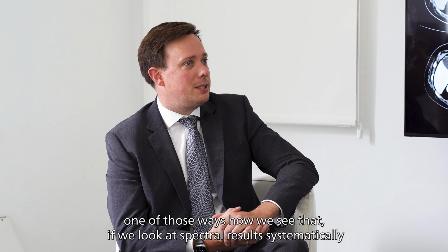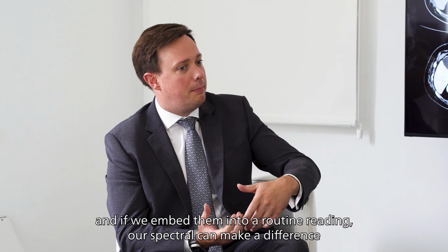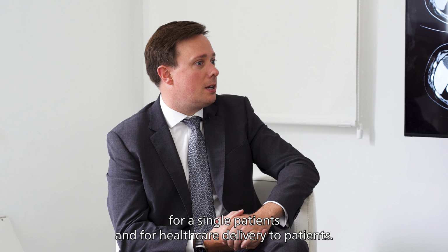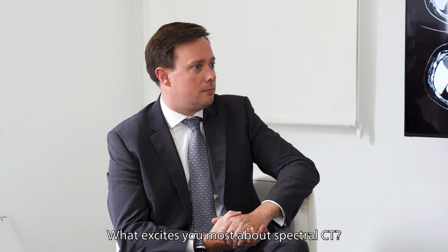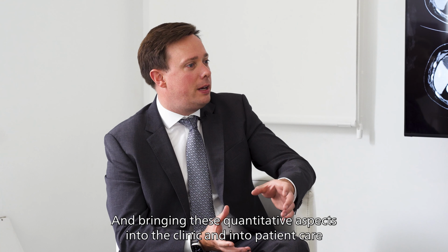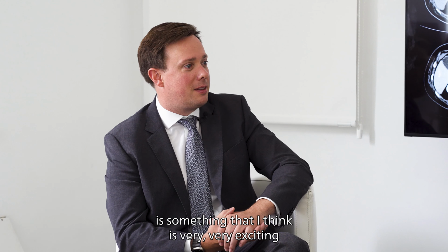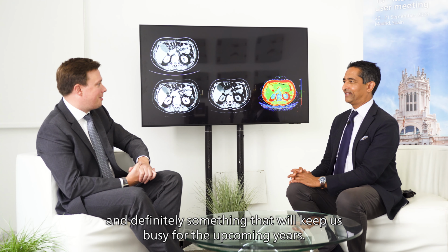Completely apparent, right? Yeah. And this is, I think, one of those ways how we see that if we look at spectral results systematically, and if we embed them into our routine reading, spectral can make a difference for single patients and for healthcare delivery to patients. What excites you most about spectral CT? So spectral CT allows us to get quantitative results, and bringing these quantitative aspects into the clinic and into patient care is something that I think is very, very exciting, and definitely something that will keep us busy for the upcoming years.